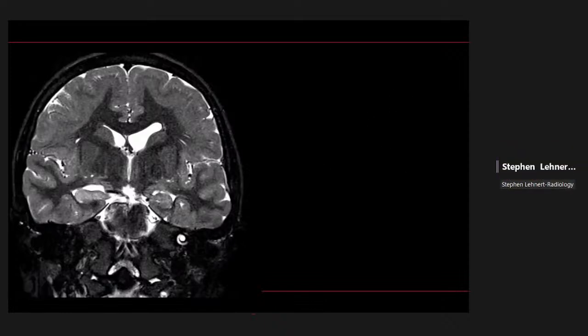All right. So what I'm seeing is just diffuse thickening of the cortex, all throughout. To me, this is more the frontal lobes mostly, like a lissencephaly type of spectrum. It's just so diffuse bilaterally. Yeah, absolutely. So there's almost like a smoothing of some of the cortex, and I agree, it looks almost thickened.